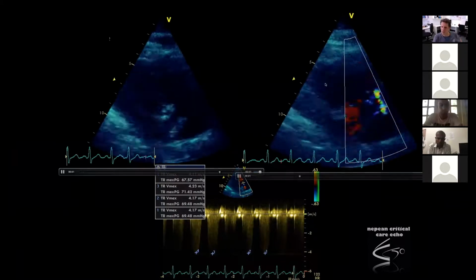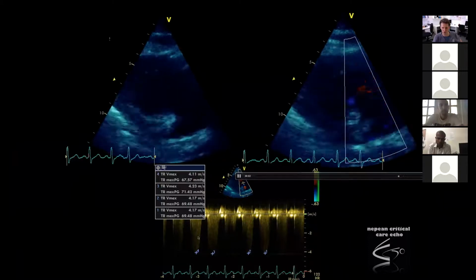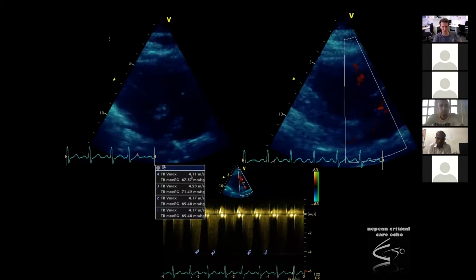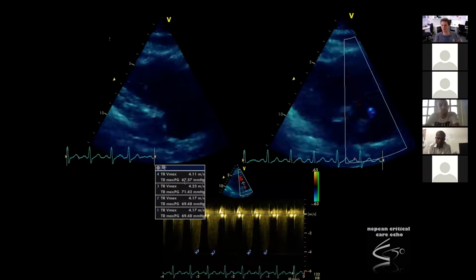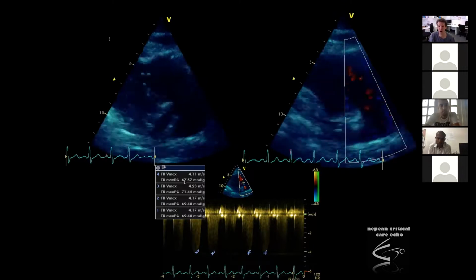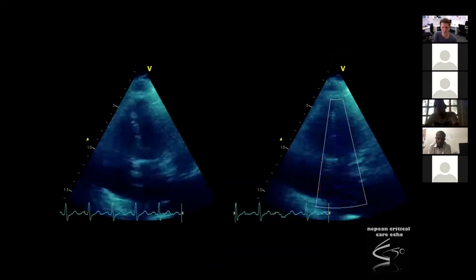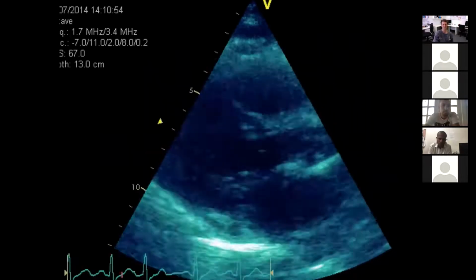So here we go. We don't have a lot of tricuspid regurg here, but we do have, on the tricuspid continuous wave Doppler, maybe a poorly optimized trace that I've got here. I've got TR Vmax of like 4. So she's got around about 70 millimeters of mercury on the pulmonary hypertension. I don't have any pre-op echoes to analyze as well. So let me just keep that in the back of your minds. Terrible pictures.